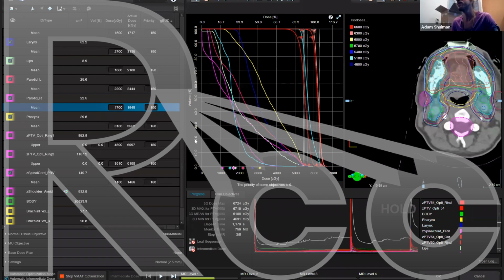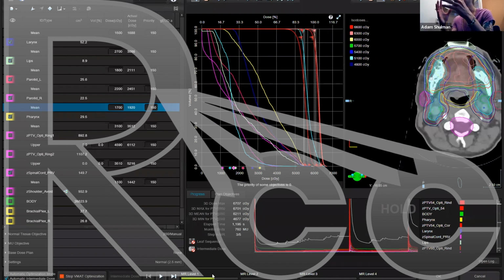Okay, yep, so this is an Eclipse thing, so I don't want to get too stuck on how Eclipse functions versus how other planning systems do, just because we have other users here. The main point I want to make is that with any optimization algorithm, you're going to start with big MLC motions, and we're looking to massage it into local minima. Then we'll show you how to lock in those local minima and fine tune MLCs near the end of the optimization algorithm. So no matter what system you use, that's the process that we want to follow.